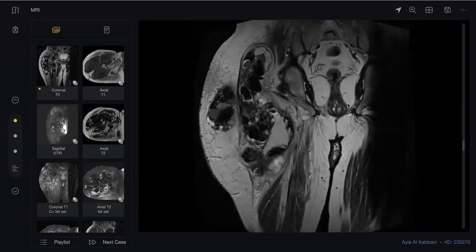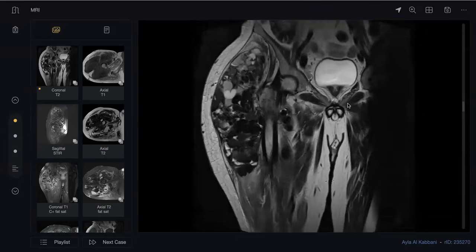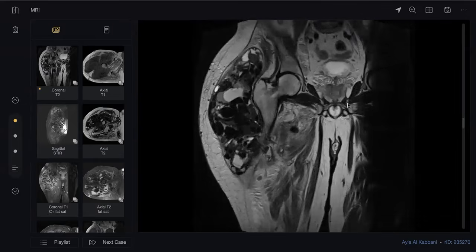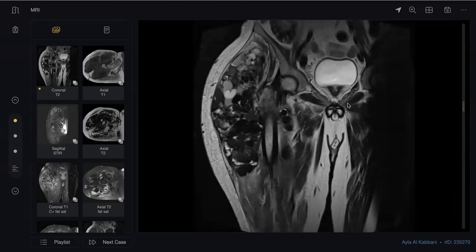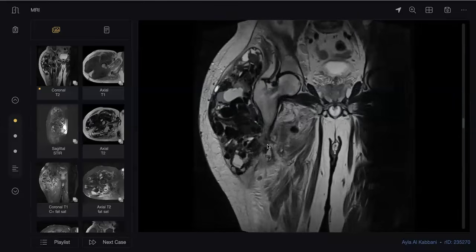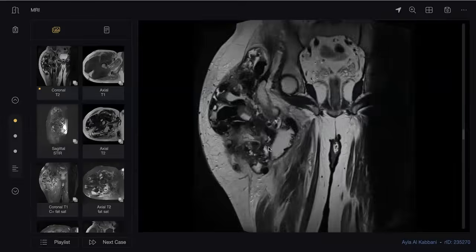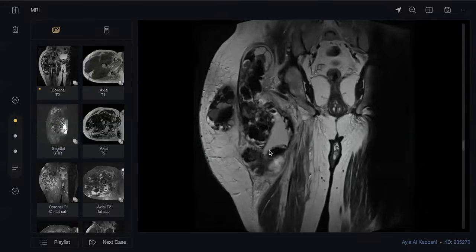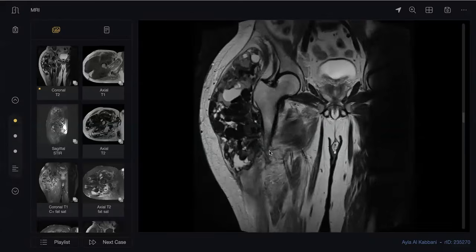This is likely to be a synovial disease. You're going straight to the diagnosis without describing the lesion. I describe the lesion as periarticular with multiple cystic areas giving a grape-like appearance, with multiple differential intensities, low signal, intermediate signal and high signal intensities. It appears encapsulated and multiloculated.